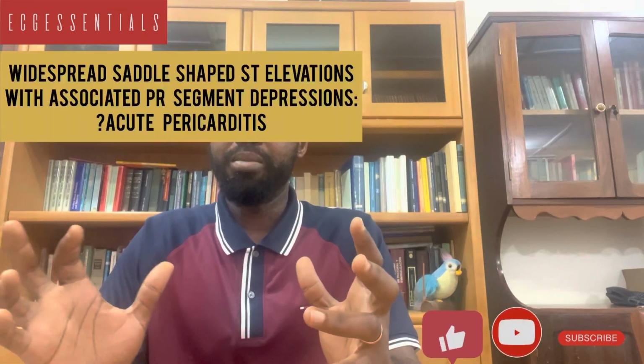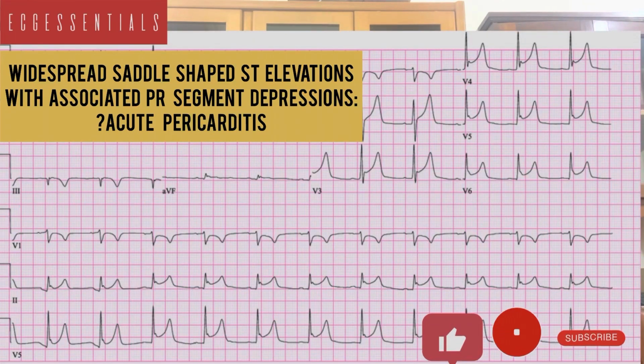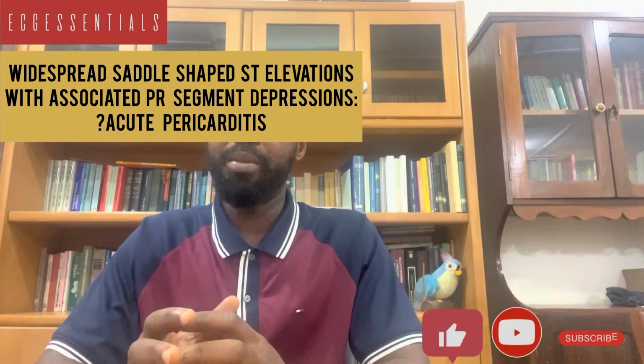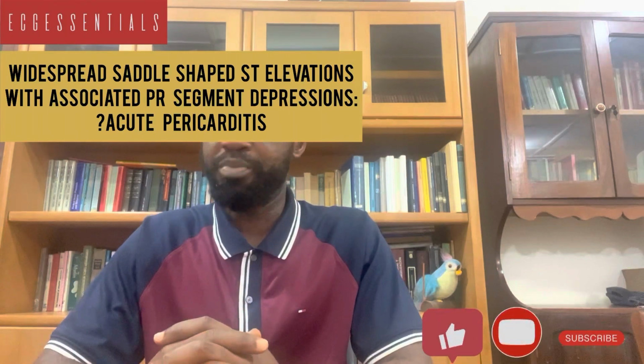Whereas widespread ST elevations, especially those that look saddle-shaped, like the concave-shaped ST elevations, widespread in most of the leads, in the context of, say, a pleuritic chest pain, may more likely represent an acute pericarditis. That's the early stages of acute pericarditis.